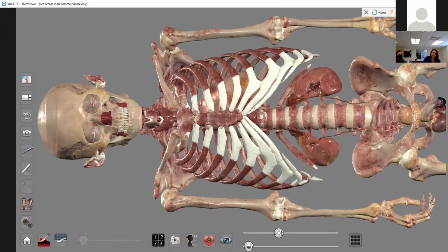And using the scalpel will do it still, or the red one? We'll do it. Okay. Wait, we'll do what? I'm sorry, I missed the question. This icon here with the red scalpel, yeah, that one. Yeah.